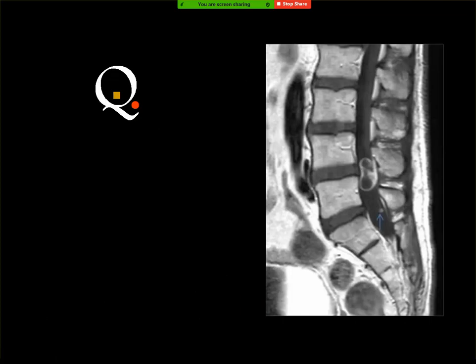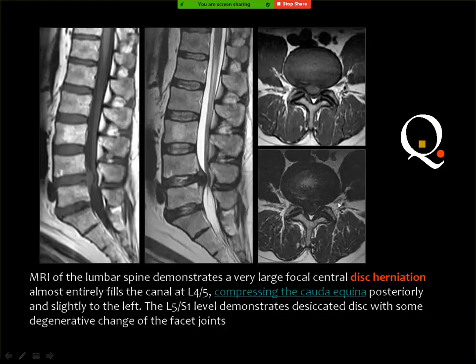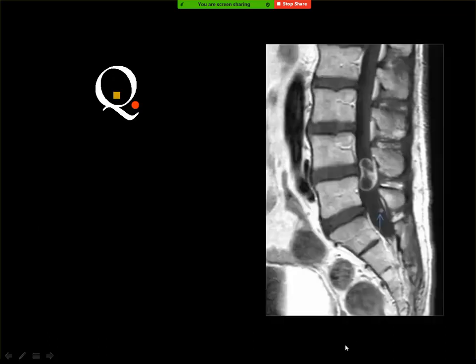Doctor, excuse me, the case before has a hemangioma. Where? In the vertebral body, a hemangioma. This one, yes. And hemangioma is an incidental finding, and you may mention it, of course, in the exam.